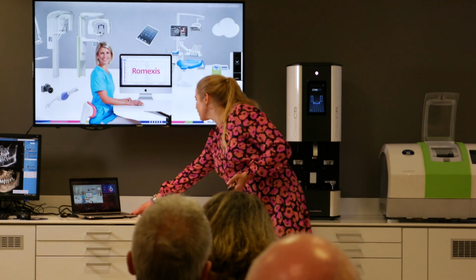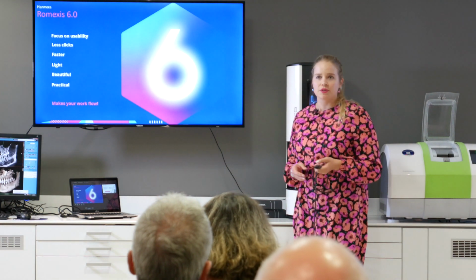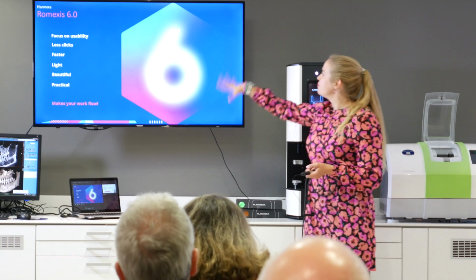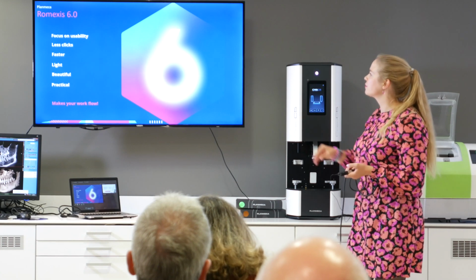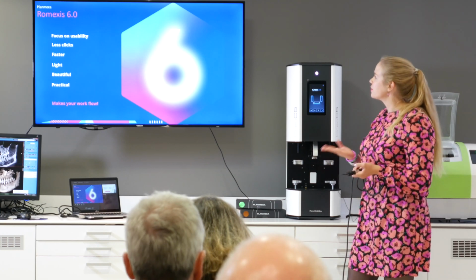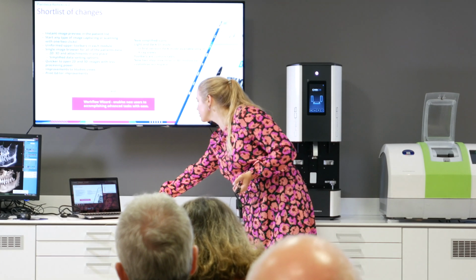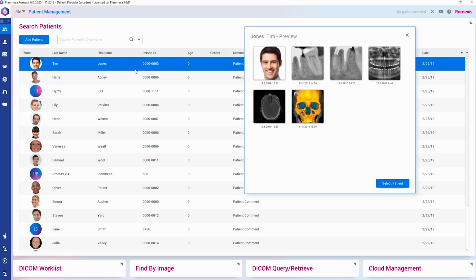So the major change that has happened is just a new design. So all the icons have been redesigned. Our designer Antti, whom you saw on one of the slides in the beginning, made some research with our customers, with us, with our dealers, in order to find out what could be better in Romexis, what are the main points that are not considered that usable, and what the users would like. So based on this, he made a little bit of redesign on Romexis. There's just a list of changes, but let's go through them here one by one.